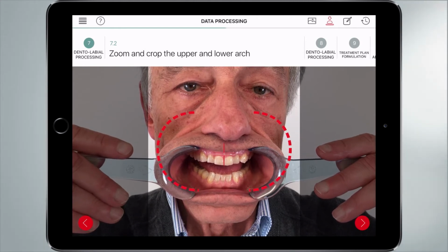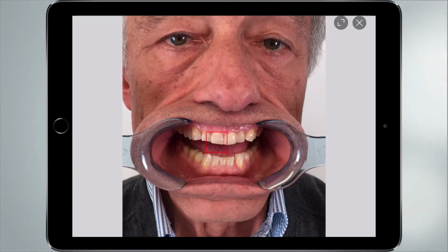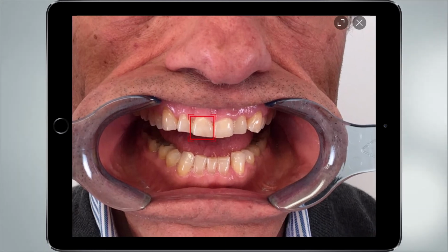And we go ahead, and we have this square, red square area here. We enlarge the image again, and we try to arrive to this position. Okay, we try to finalize this value here.